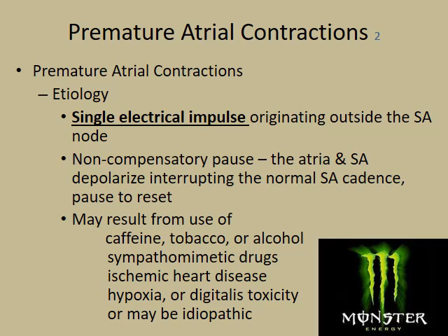PACs are just one single electrical impulse outside of that SA node. And then there's a non-compensatory pause. There's a pause that resets that SA node, so it fires, sort of shuts down that little ectopic focus.